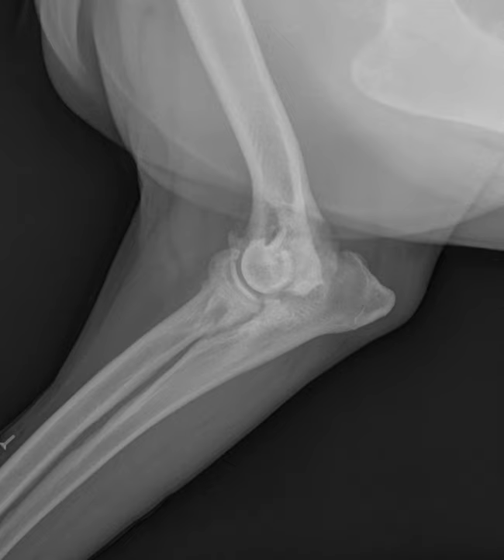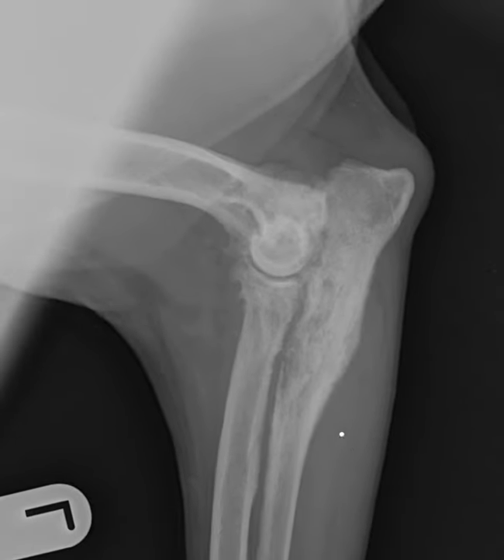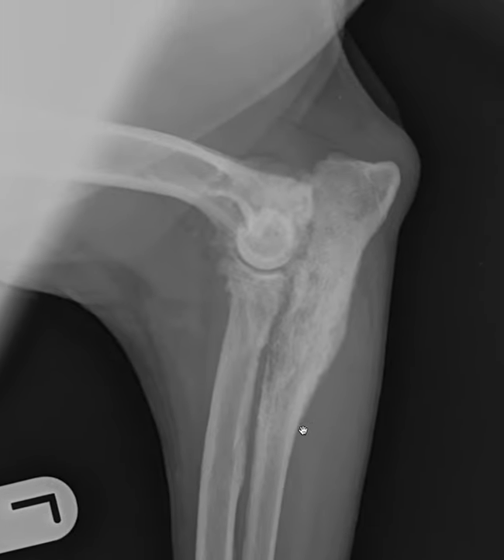Now, you'll recall that we've been doing the ABCDs and that I've been focusing on B for bone. I'd like to continue to do that, and I'll highlight the most important findings for B for bone in this case. Starting with the lateral view. You'll recall that I like to trace every bone on every view. I zoomed out to allow us to get a good view of the elbow.